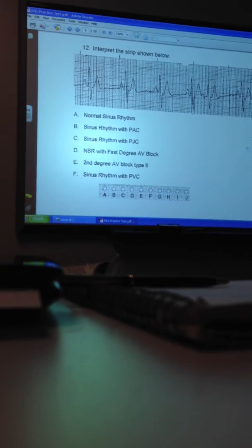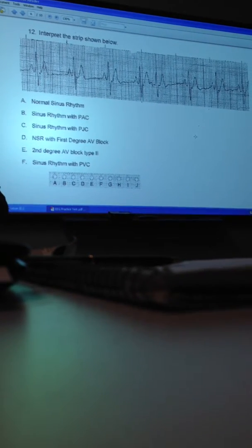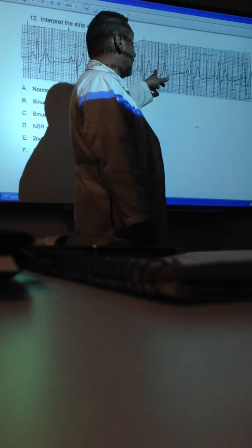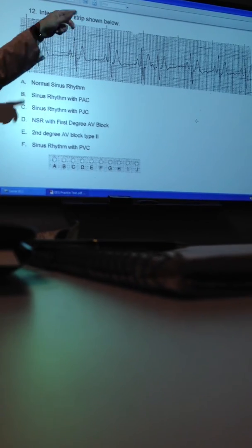What do I got? There are P waves. Is it normal sinus? Right there, look. We have sinus beat, sinus beat, sinus beat, sinus beat, and then a beat that comes in early. Then sinus, sinus, sinus. So we've got sinus with an early beat.